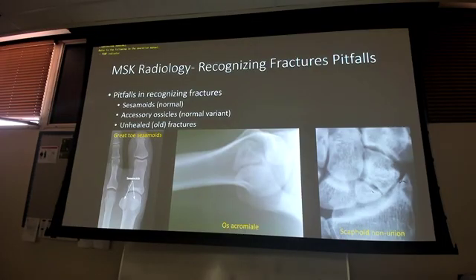Really what this is showing you is watch out for old fractures. Old fractures that get healed and don't unite together can be mistaken for new fractures. A couple of ways you can tell this. There's two primary ways. One, when I look at it, if I follow my cortex all the way around, both of these pieces have actually smooth cortexes. They look like two bones right next to each other. That's step one. Step two is, what else can I do?